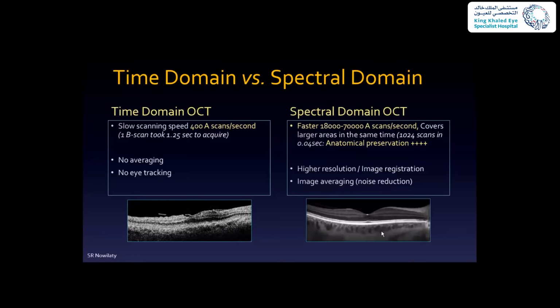Now, you may ask me, what is averaging? Well, averaging is when you take several shots, or several exams of a specific area, and then put them all together. Anything that is extra, that doesn't correspond, that you don't see on every single image, is taken out, and any detail that you see on several images is taken in, and then you get something of a much crisper quality than images that have a lot of noise.